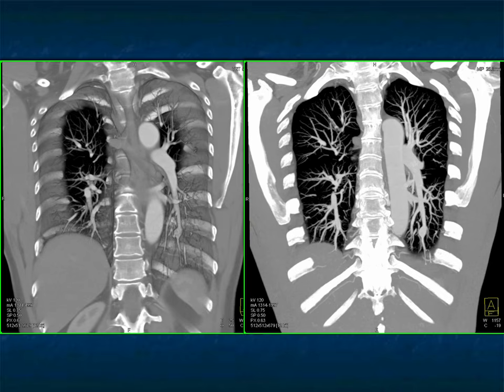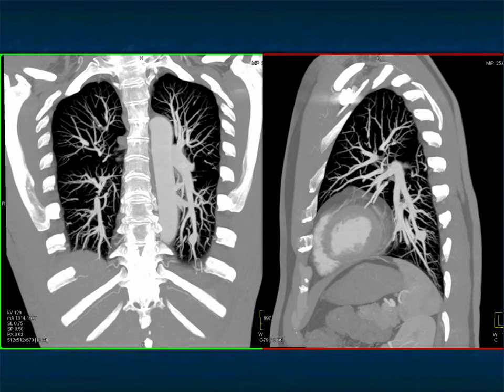One of the things important when you see a pulmonary artery aneurysm, a pseudoaneurysm, is to look for additional abnormalities. Most cases usually are solitary, but because of conditions like vasculitis, you need to think about multiple pseudoaneurysms or aneurysms being present.